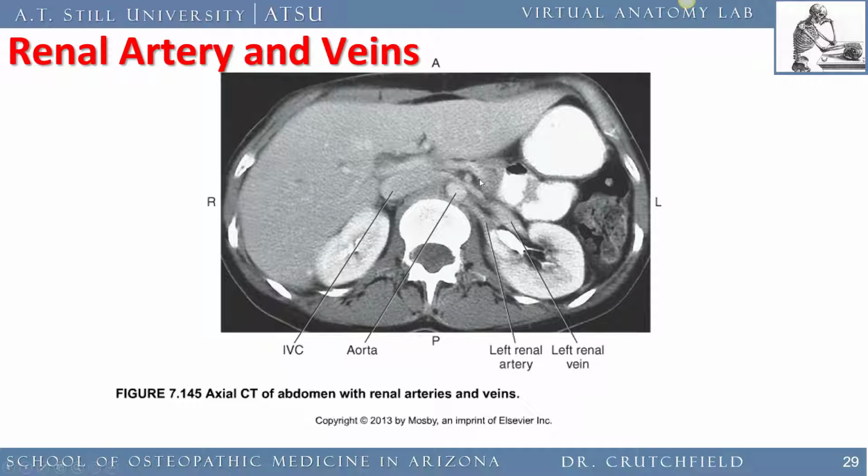I suspect that this small area that has some contrast in it, there's some whiteness here, is probably a portion of the pancreas, because we know that the superior mesenteric artery and the superior mesenteric vein, which I cannot see here, come out beneath the head of the pancreas. So this has got to be probably a portion of the pancreas, but I'm not 100% sure.